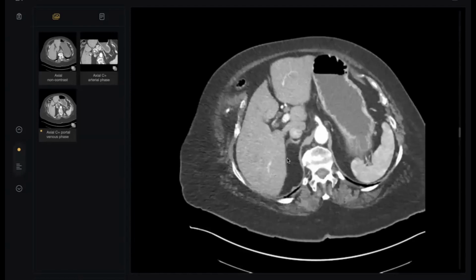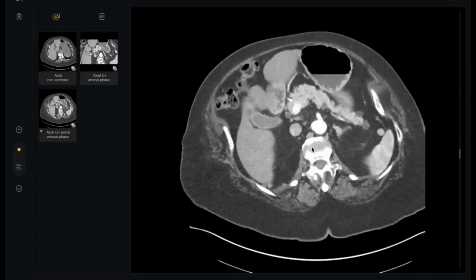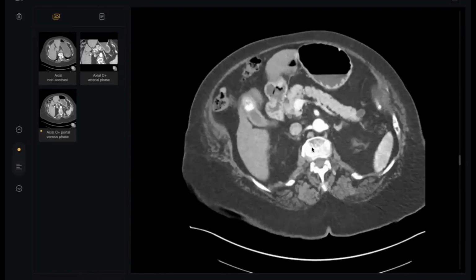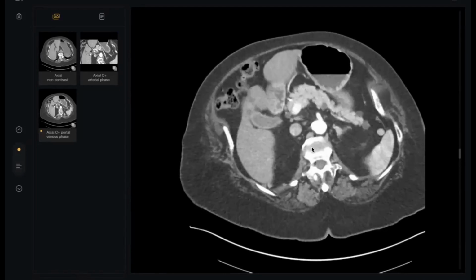Where is your main pathology, Doctor? The main pathology is, I have a problem with the scrolling, that's the issue, but the main pathology is in the liver. There are multiple cysts at the liver. I'm trying just to see the relation. No. Liver? Sorry, the pancreas, I'm sorry. Yeah, the pancreas. I will help you. This is a pancreas. It will be great if you have. You didn't request, and this is the style of the exam. Request, I will give.